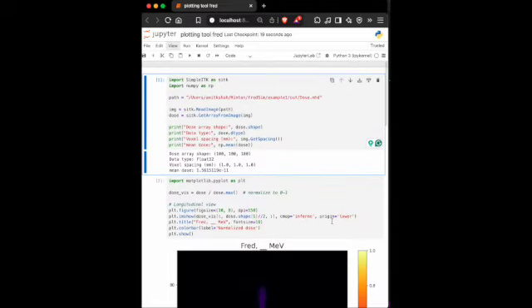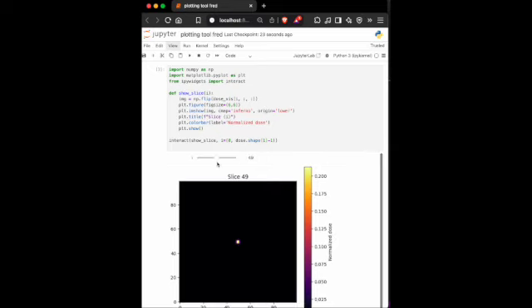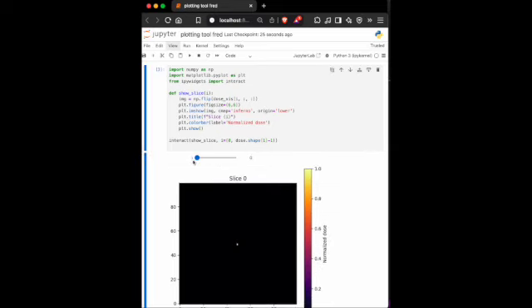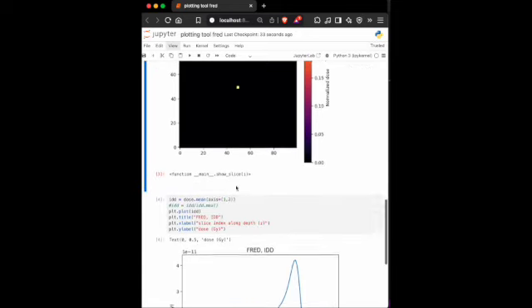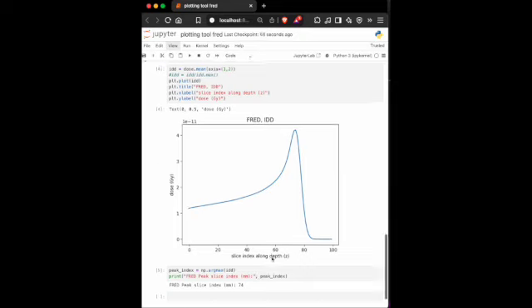Well. Now the pencil beam appears to be a little bit weird. That's my pencil beam entering, and indeed the Bragg peak is at 74, because for 120 MeV it reaches around 100 millimeters or something.